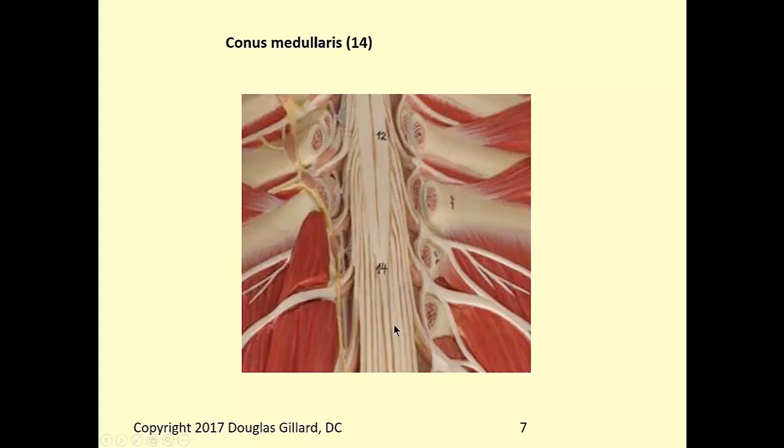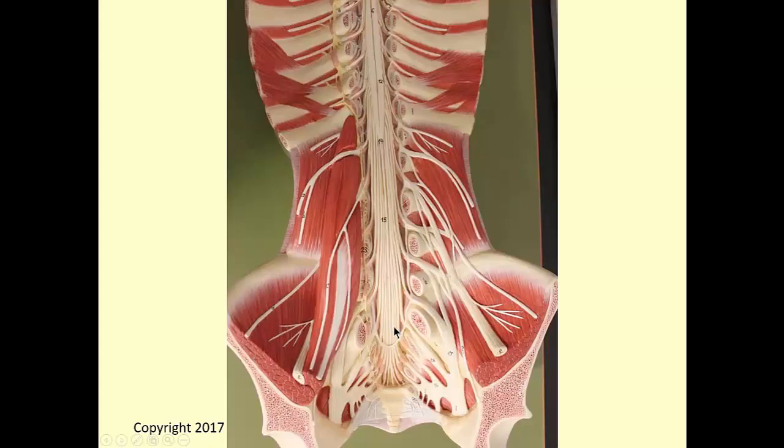When you're a little kid, this extends much further down. But you kind of leave it behind when you grow. So this is the cauda equina. There's a filum terminale. See it right in the middle, which is a weird little structure. It goes all the way down to the coccyx, anchors itself to the back of the coccyx. What are these things? Well, where's the posterior arch? It's been cut away. Those are the pedicle stubs. So we've pulled the posterior arch right off here.